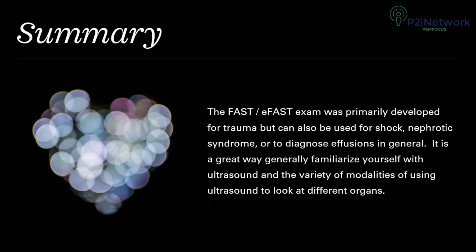In summary, the FAST exam and extended FAST exam can be used in the setting of trauma, shock, or in patients with nephrotic syndrome or other reasons to have effusions that you may want to look for. It is also a good way to generally familiarize yourself with ultrasound and with a variety of modalities of using ultrasound to look at various organs.